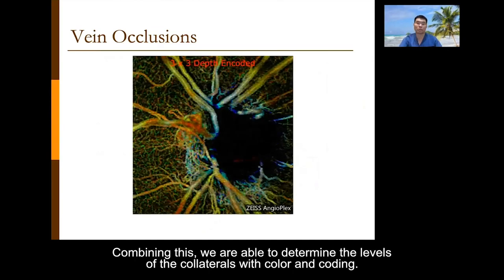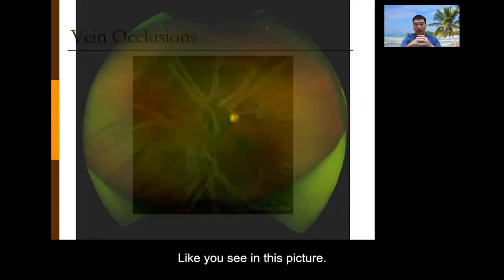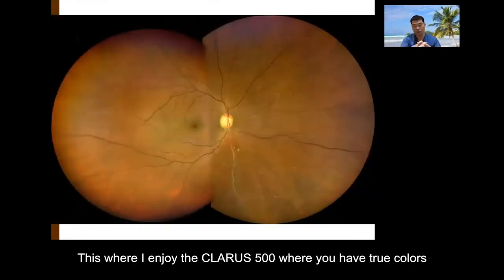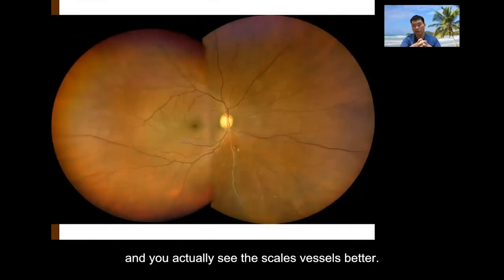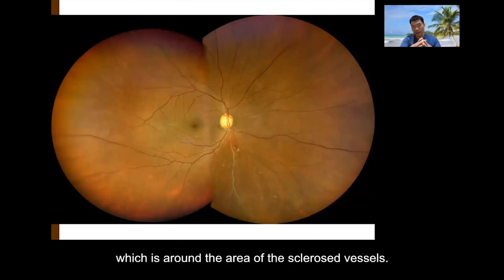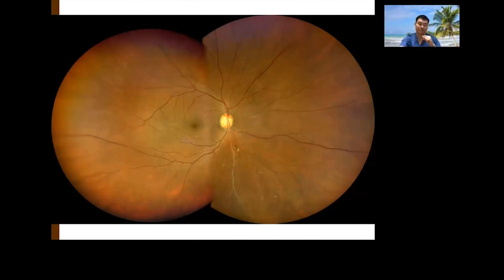Combining the superficial and deep cuts, we are able to determine the levels of the collaterals with the color coding like we see on this picture. Another example is a patient with an inferior vein occlusion, where you can see a sclerosed vein inferiorly. This is where I also enjoy, for example, the Clarus 500, where you have true color, where you actually see the sclerosed vessels better. Again, you may be able to see the pigmentation or the wedge-shaped pigmentary change of the retina, which is around the area of the sclerosed vessels.